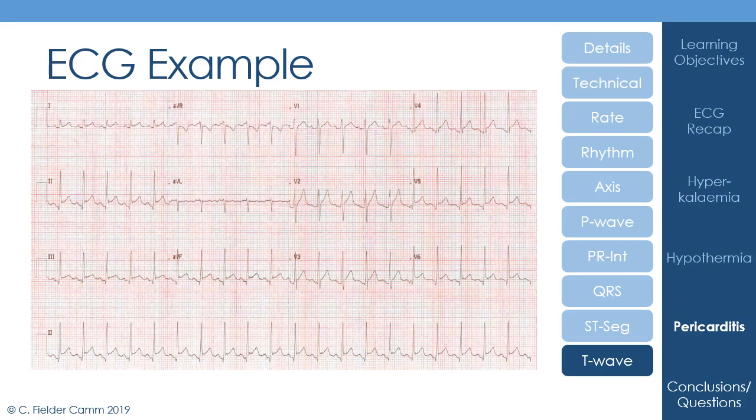What about the T waves? Well, T waves all look to be okay, to be honest. There's certainly no T wave inversion. I think some people might think that the T waves in lead V2 are slightly pronounced. I wouldn't be too concerned by that. Thinking about hyperkalemia, which we've talked about already in this lecture, that tends to be a more global appearance. So I think an isolated single lead like this, I wouldn't be concerned.